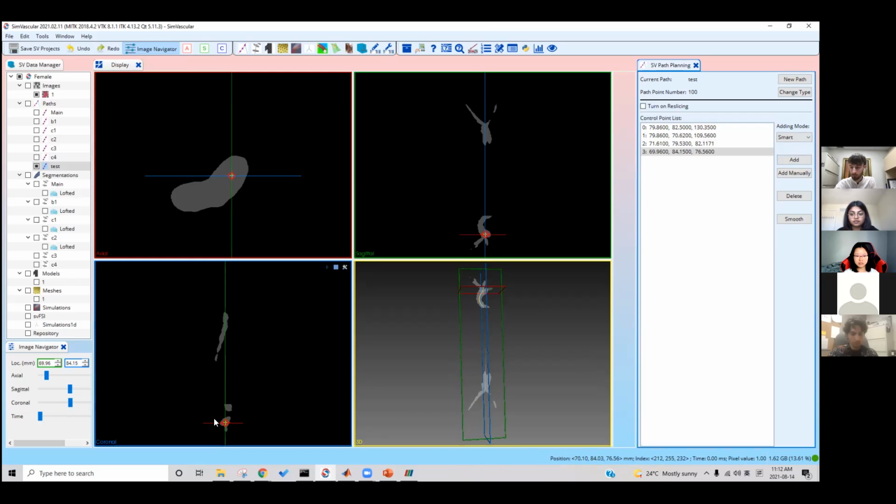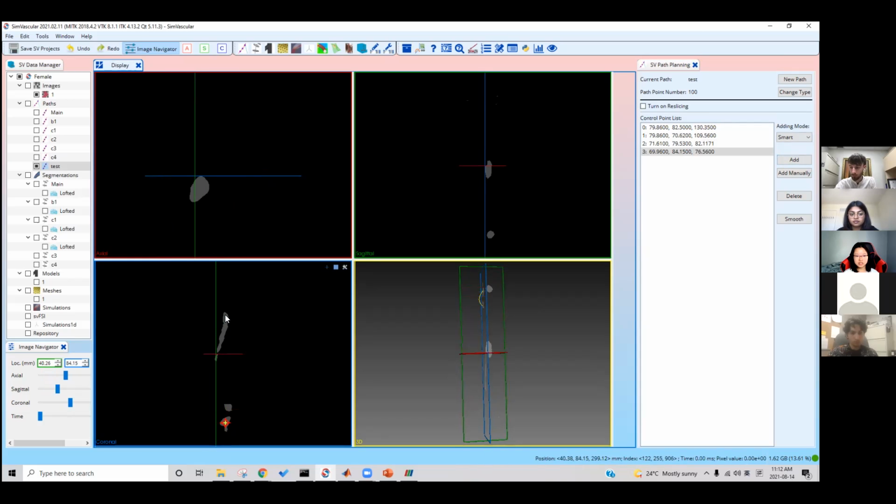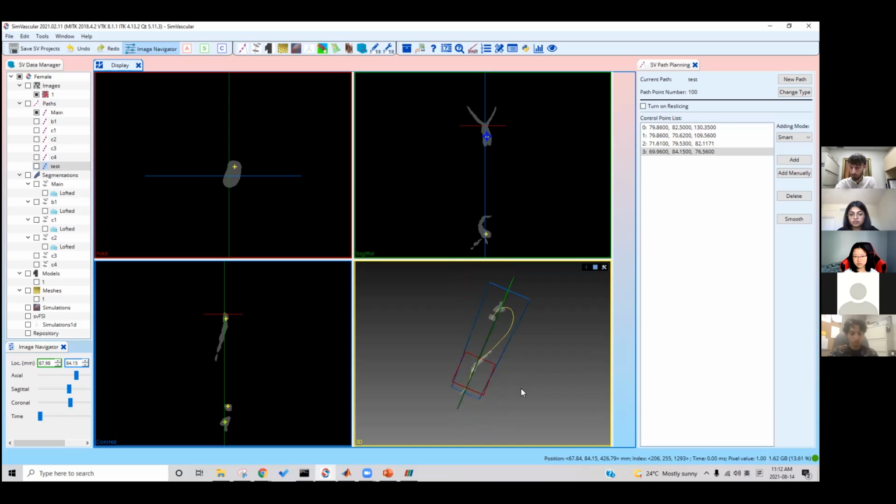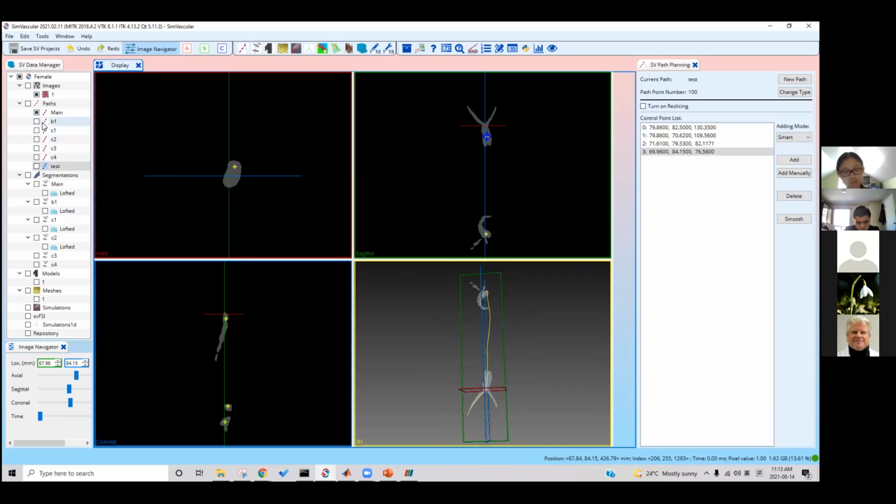So you keep going down the thing until you reach the end of your one vessel and you're happy with it. And the end result is going to be this. So as you can see, it kind of curls around and it goes down. So this is called main for a reason. It's going to be main aorta. And then you keep going with the different blood vessels.